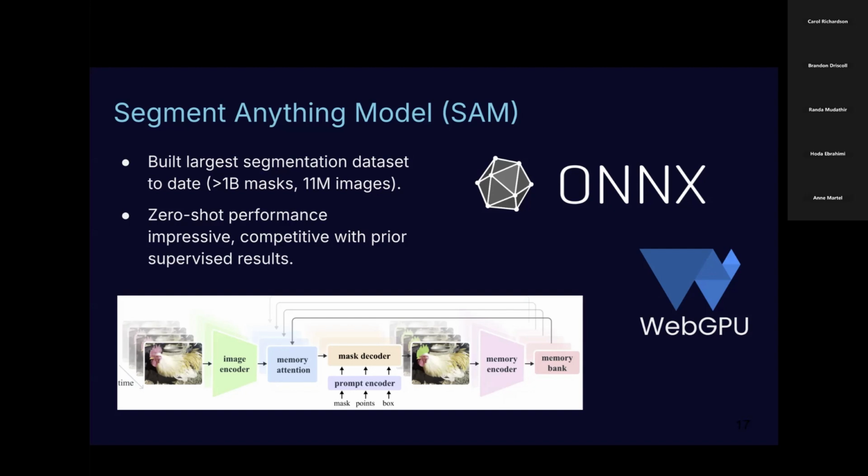But in other use cases, sometimes we don't need the full complexity. We just need AI assistance that helps with the segmentation. So that's where our client-side AI segmentation comes in. This is our newest addition to the segmentation tool stack that we have. The model is by Meta. It's the Segment Anything model. It's an encoder-decoder model, and as you know, it is not written for the web.